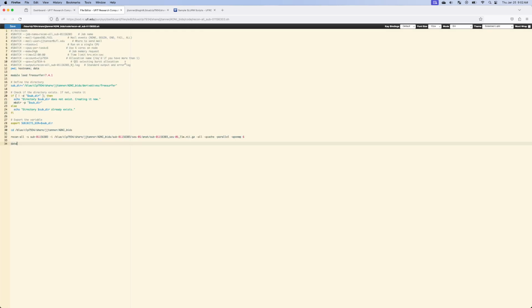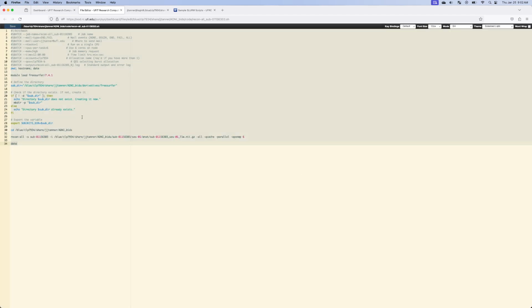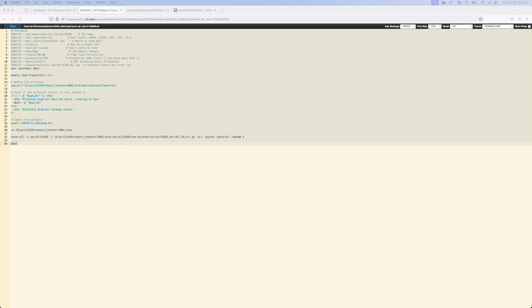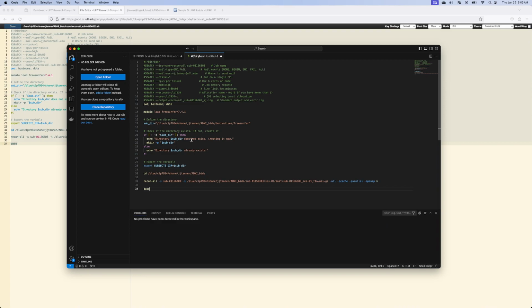So I just deleted all of it. That's not what we want. Paste it back just to show I have it copied. Save it. I think it's saving. I didn't get an error. Got an error, but I think it might be saved. But before I go out of that window, I'm going to open up Visual Studio Code, and I'm going to paste all of that into Visual Studio Code.